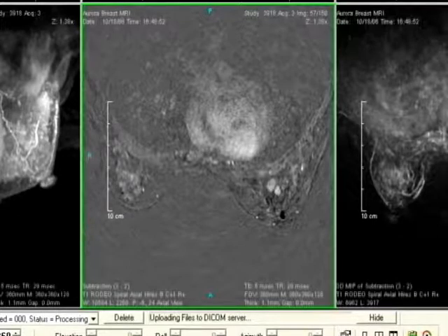This type of image processing is not possible using T2 images, and the resolution of the non-spoiled RODEO is far superior. In addition, some cancers are bright on T2 weighted images and are difficult to differentiate from cysts. The high intensity of cysts on non-spoiled images is specific for long T2 fluids, and cancers will not be hyperintense.